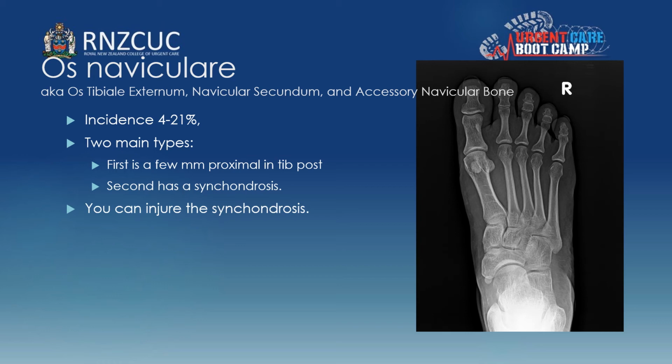You can get 2 types, one close to the tibia, close to the navicular, and one a little bit further up depending on where they are within the tib post tendon, and you can see it's demonstrated just there. You can injure the synchondrosis between these and it would be a source of ongoing pain. But this is an instance where a little bit of time and clinical examination will determine it, and then you can send them off to get specialist investigations should the pain be ongoing.